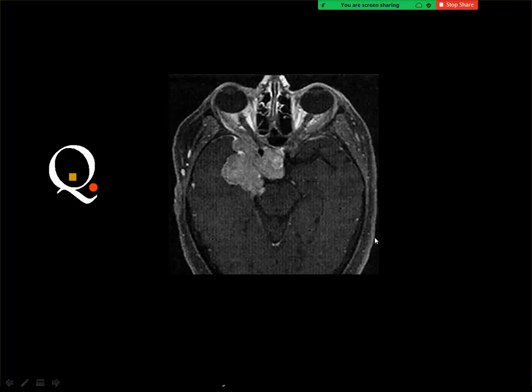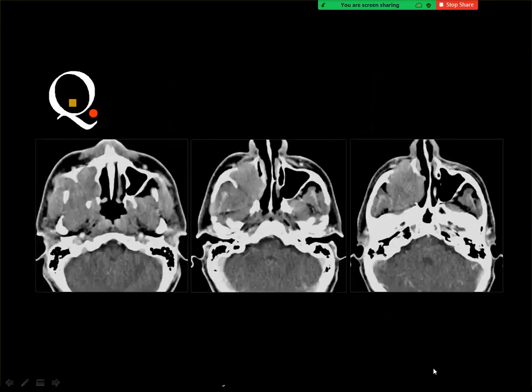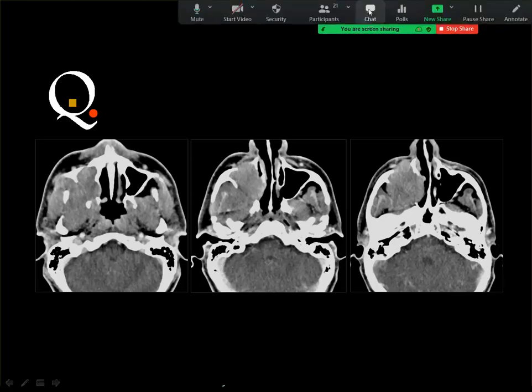Meningioma is the lesion in a classic location, with homogeneous enhancement and a dural base with extension into the orbit as well as into the sella. Then this is one of the types of skull-base meningiomas that occur in the anterior or in the middle cranial fossa. This patient with a mass in the region of the right maxillary sinus.